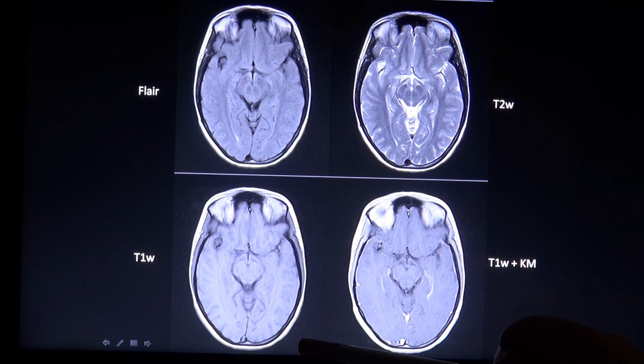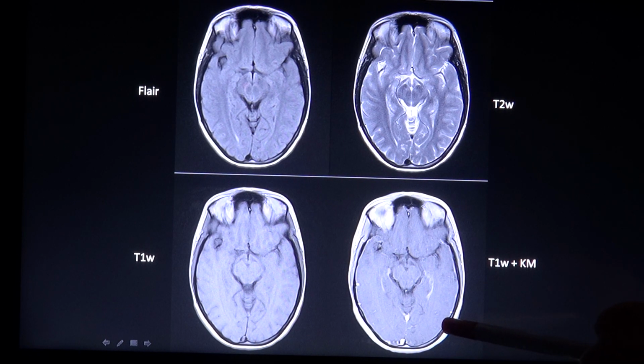Vessels are normally not seen on a T1 image without contrast application, so in order to see normal vessels as well as vascular changes or disruptions of the blood-brain barrier, it is useful to give IV contrast agent. The contrast agent used with MRI imaging is gadolinium, a rare earth metal. So the contrast-enhanced T1 image looks like a non-contrast T1 weighted image, but with the bright arteries and veins.